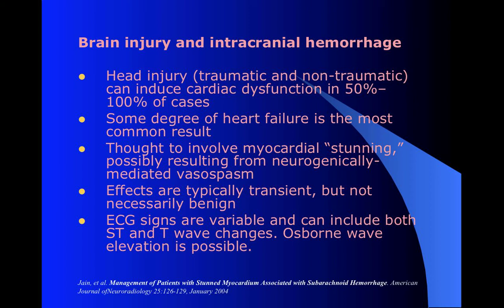And it can look different, but there's kind of a classic look which has these very huge, deep inverted T waves. Neurogenic T waves are sometimes called. And there can be various other changes. Sometimes it actually has an Osborne-type wave, which you'd associate more with hypothermia usually.